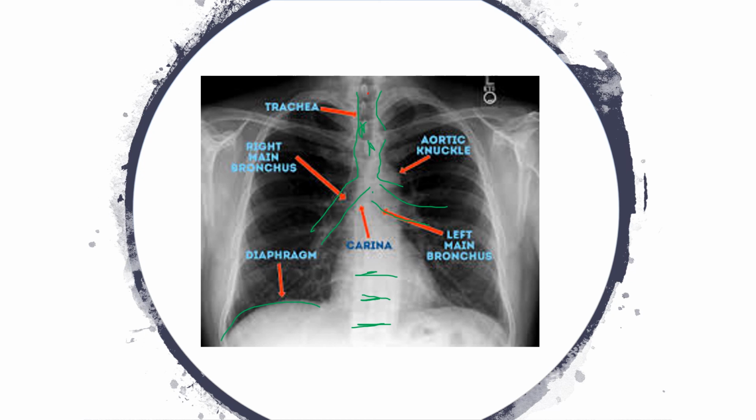Obviously the diaphragm. The right diaphragm is going to be a little bit higher than the left diaphragm because there's an organ over here. Do you remember what organ this is? Under the right side of the lung. Hint, if someone is a big time ETOH abuse person, this one will be enlarged and therefore push it up. Right, it's the liver. If someone had hepatomegaly or hepatosplenomegaly, that right side could easily be pushed up. So it's normal for the right hemidiaphragm to be a little bit higher than the left.